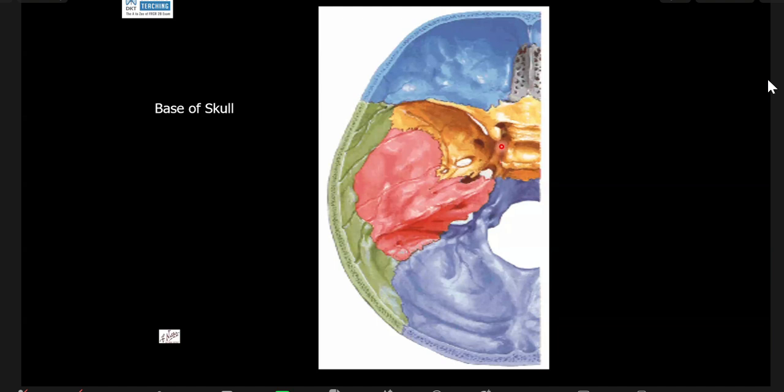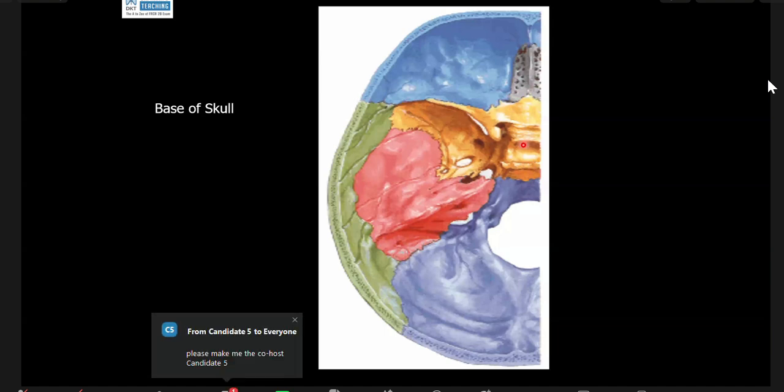This part of anatomy is important where my pointer is, and this is the parasellar region. This is where the cavernous sinus will be sitting, and this is where the cavernous portion of the internal carotid artery will go anteriorly. So this portion, coming back to the bone, is all basisphenoid, and here things like dorsum sellae, sella turcica, and tuberculum sellae, etc. This is the pituitary fossa. All of these things are better seen on a sagittal.